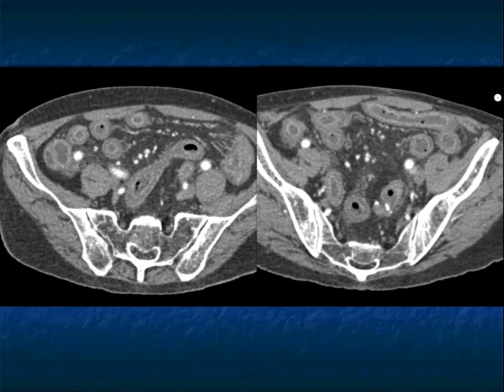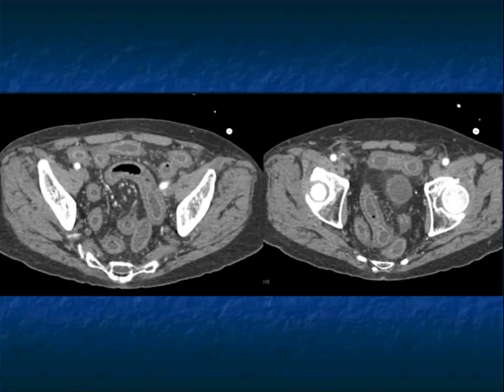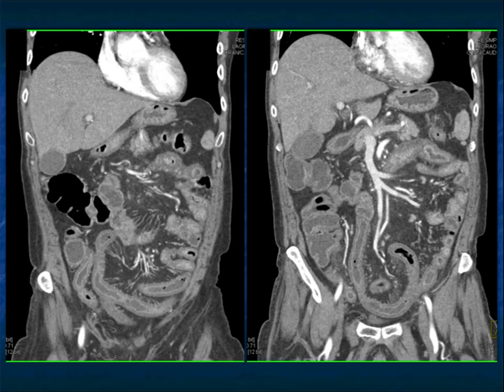Now you could say, well, Crohn's gives you a halo. Crohn's can be fairly extensive, but this might be a bit more extensive than you typically see with Crohn's disease. You also see lots of haziness in the mesentery, prominent vessels, but those are good for Crohn's disease. So am I dealing with Crohn's disease? Well, I look and it's almost too extensive. And then I ask myself, what else do I know about this patient?